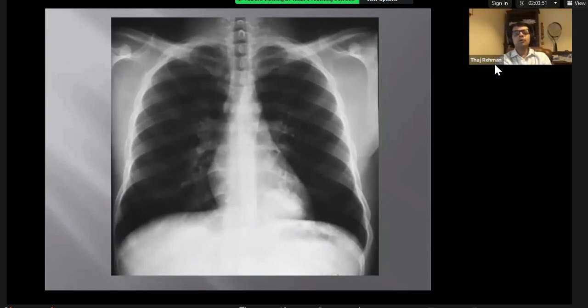Now, in your practice, even in exam, if you are given a lateral X-ray first, it's completely fine. I would have accepted it if you had asked for the frontal radiograph first. It's fine if you can say that in practice everywhere in the world, you will be looking at a frontal chest X-ray first, and then look at the lateral X-ray later, or at the same time. So you should start from a frontal X-ray. It would have been completely okay for you to say, this is a lateral X-ray, but in normal practice, a frontal X-ray will be looked at first. So can I have the frontal X-ray, please? Yeah, you can say that.